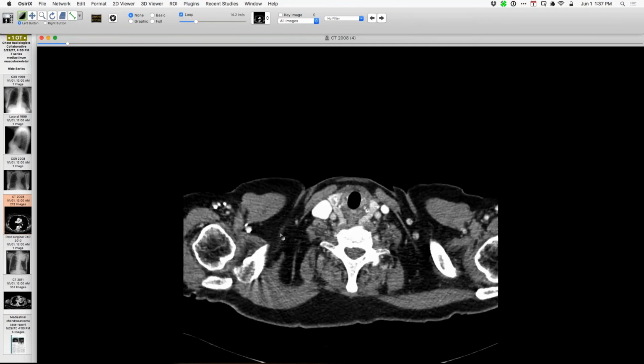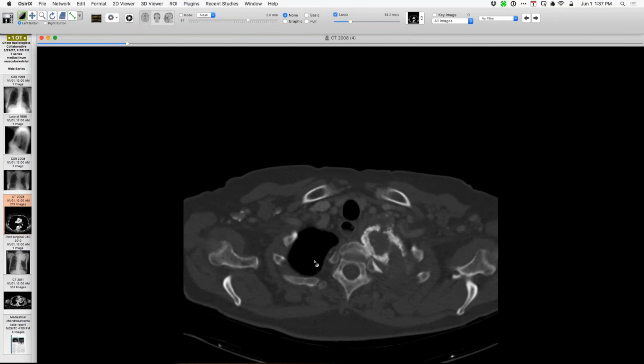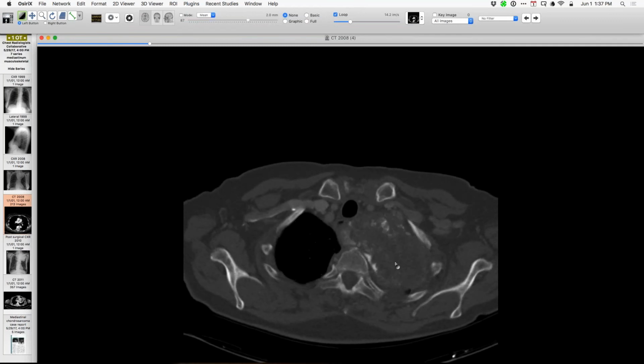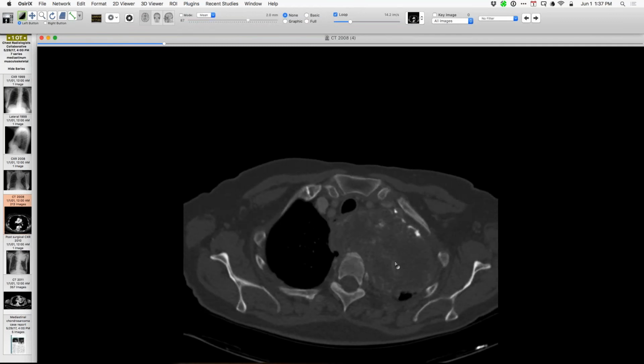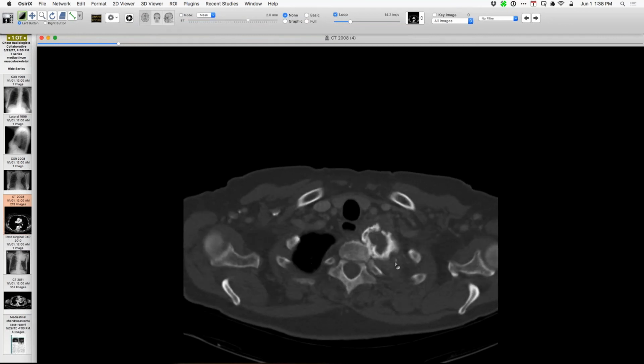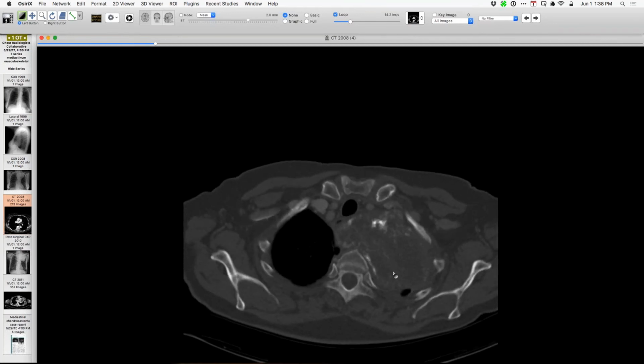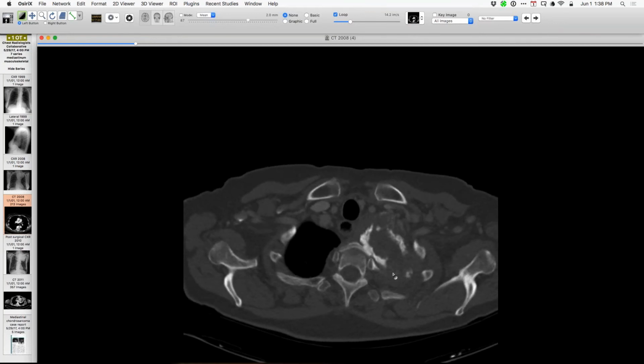It's kind of a moot point, obviously, as to whether it really came from that vertebra or not, but it's certainly pretty close. But the epicenter is a little bit away from it. Well, at least it's quite large there. Any additional thoughts about this other than just an unusual case of a mediastinal chondrosarcoma?